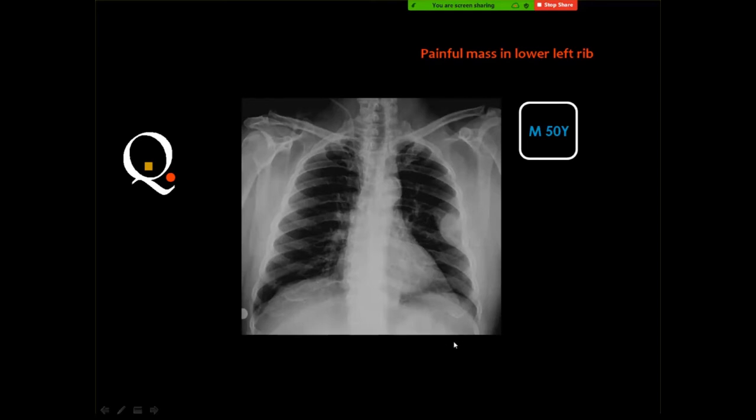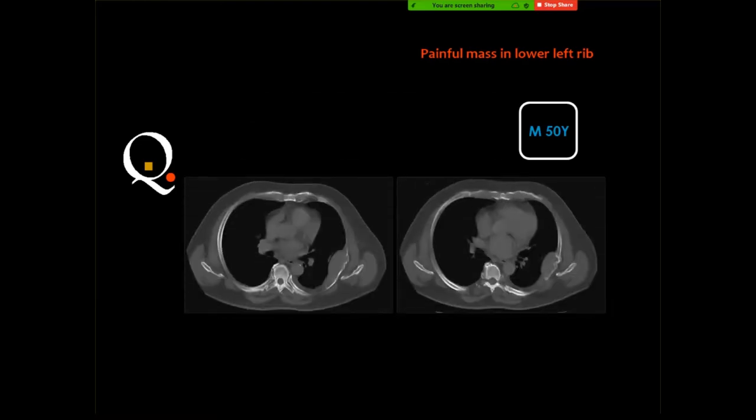Could be a pleural mass like mesothelioma, if we think of a malignancy, or pleural cyst. Then what do you need for further evaluation? CT scan. Okay. It denotes that there is pleural thickening with the destruction and erosion of the surrounding rib. Yeah. This is most probably Ewing sarcoma if it's in a young age, and mesothelioma in an old age.